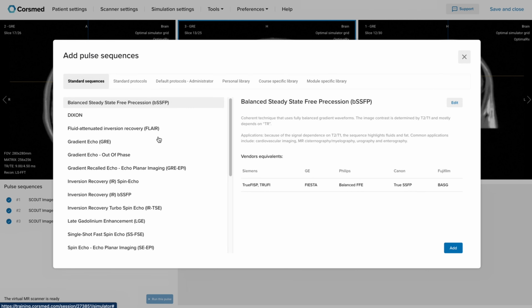So, what sequences does a standard pituitary protocol include? The typical sequences are coronal T2 weighted, sagittal T1 weighted, and post-contrast T1 weighted. If a post-contrast acquisition is required, the clinician will usually suggest it, provided that the patient's renal function is within healthy limits. Because the pituitary gland is so tiny, we will also acquire some additional small field of view and high-resolution coronal T2 scans so that we can see the pituitary clearly.